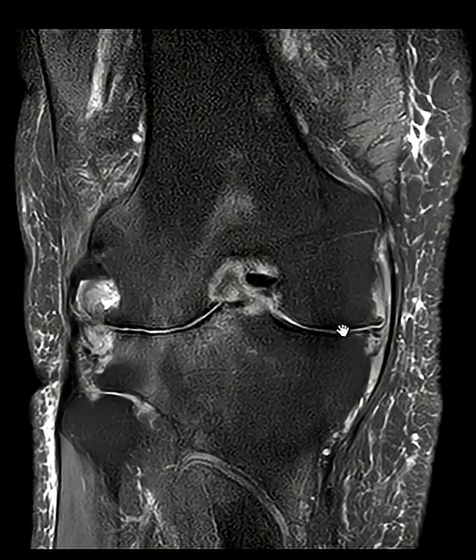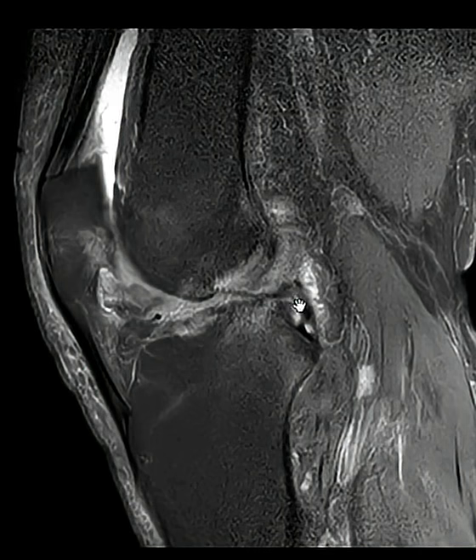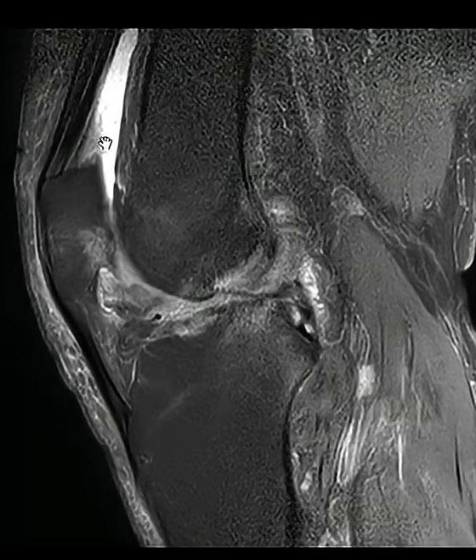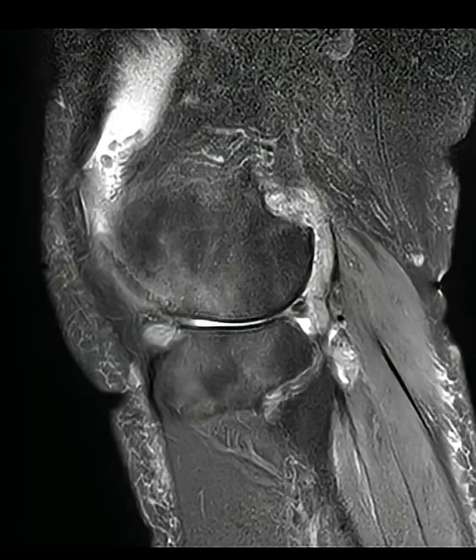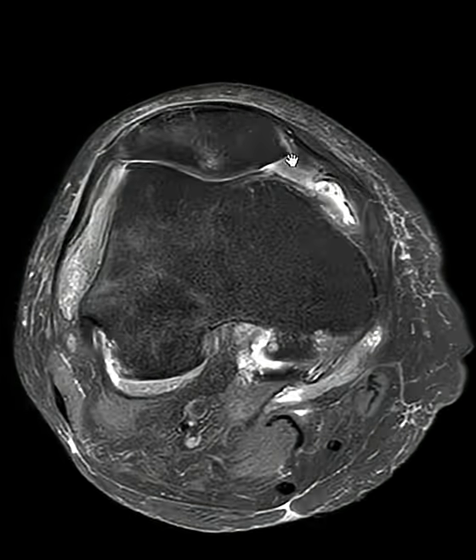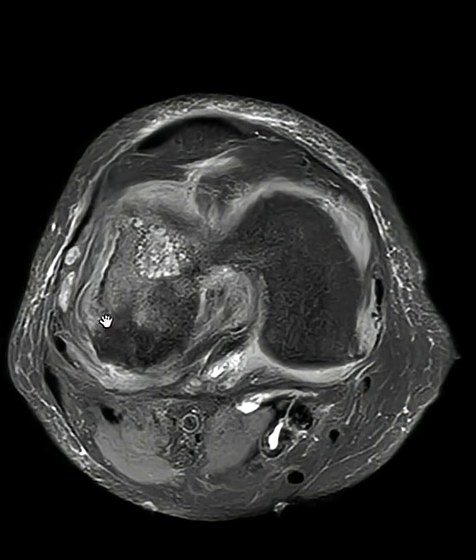Out here we also see complete loss of cartilage, bone-on-bone appearance, so a prominent synovial inflammatory process. If we look in the sagittal view here, we see that there's fluid in the front of the knee, complex fluid, and these little nodular things are synovial inflammation or synovitis. We can see them over here on the lateral side, looking like little rice bodies. So advanced diffuse synovitis, and we see an erosion out here.